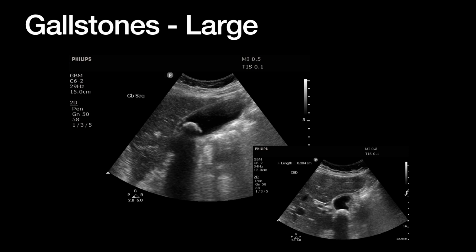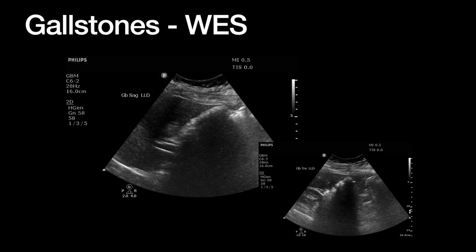One other thing that you're going to run across in the consideration of normal cholelithiasis picture is something called the wall echo shadow sign, right? And so the theory is, okay, if you have a layer of stones, you're going to have your gallbladder anterior wall, you're going to have some bile in there, you're going to have the stones at the bottom. It all looks pretty good. There's a lot of contrast, so it kind of catches your eye. But what if that gallbladder is so full of gallstones that there's no room for the bile in there anymore, right? It's all stones, right?